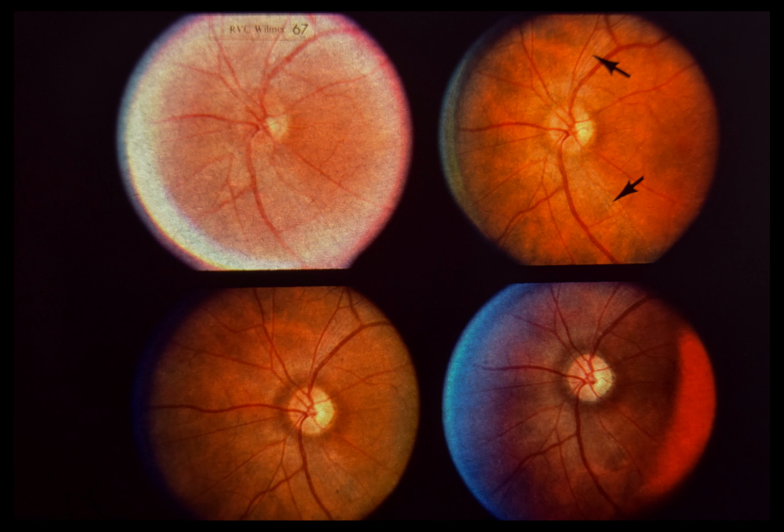Upper left. The left optic disc is normal. Over the next week, the patient's vision improved to 20/25. However, 3 months later, he again experienced visual loss in the left eye, and visual acuity was recorded as 20/400. Upper right. At the time of the patient's second episode of visual loss, there are nerve fiber bundle defects in the superior and inferior arcuate areas, and there is definite temporal optic disc pallor.